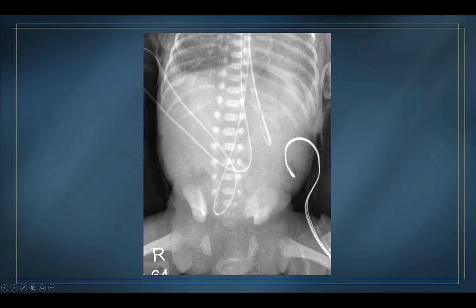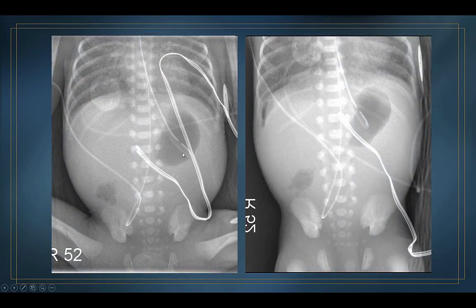So 4 days later, this baby had a repeat radiograph. This just shows you some preemies are just sort of indestructible. He had a pneumoperitoneum 4 days before, and here he is 4 days later. And you can see a small amount of free air over the right lobe of the liver. This is a very funny-looking loop of bowel. I mean, it could be extraluminal air, but this pneumoperitoneum right here, again, I do not see it on the supine radiograph. He doesn't have a cupula sign anymore. So again, you've got to do a decubitus film.